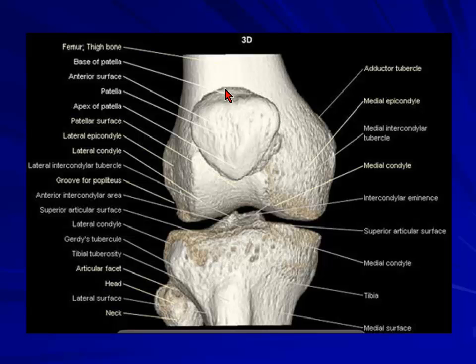The knee joint comprises the patella, that's the anterior compartment, and that's the facet where the retinaculum we discussed earlier, that the vastus, rectus femoris, along with vastus medialis and lateralis, join in and form a retinaculum, and the tendon attaches here, forms a sheath around this, and it goes down and forms the inferior patella retinaculum, and it attaches just at the superior margin of the tibial tuberosity.